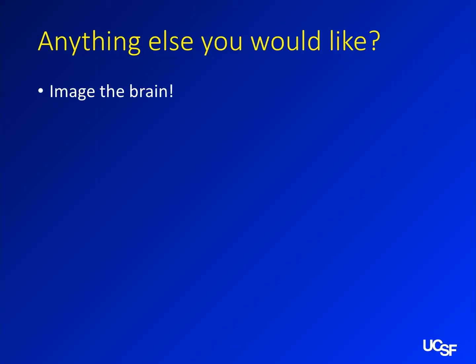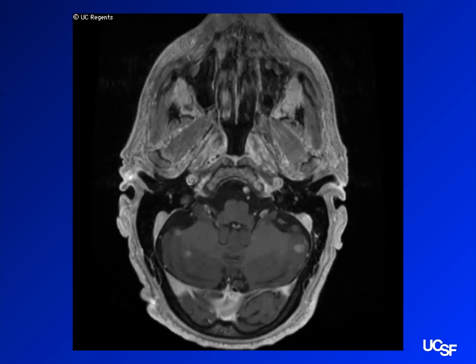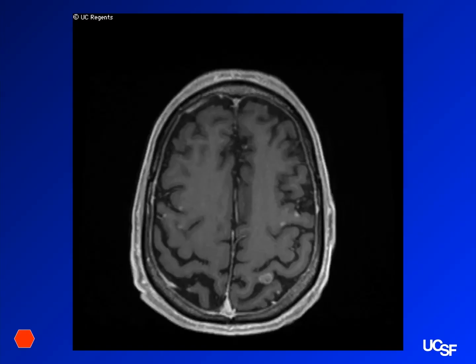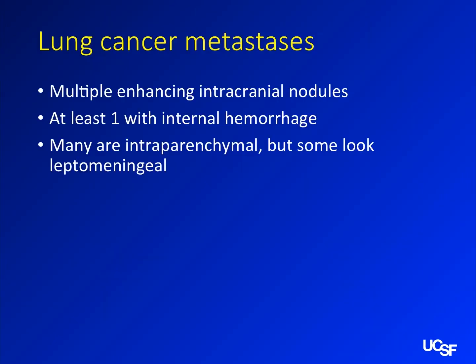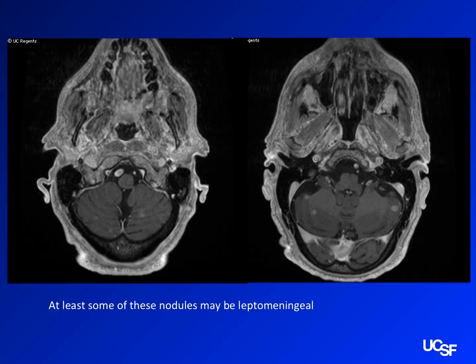You know that he has drop mets in his spine. You know he's got bone mets. You need to look at his brain. He's got brain mets, a bunch of little nodules. Got this little one with hemorrhage over here. More nodules over there. Some of these are leptomeningeal in the brain as well, some of those coating the spine. Some hemorrhage there. You know there's leptomeningeal mets in the spine.